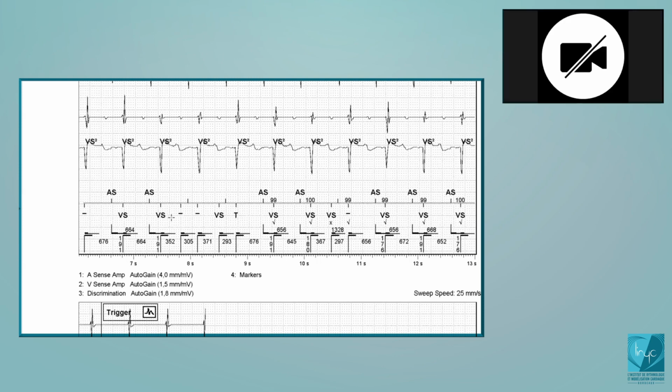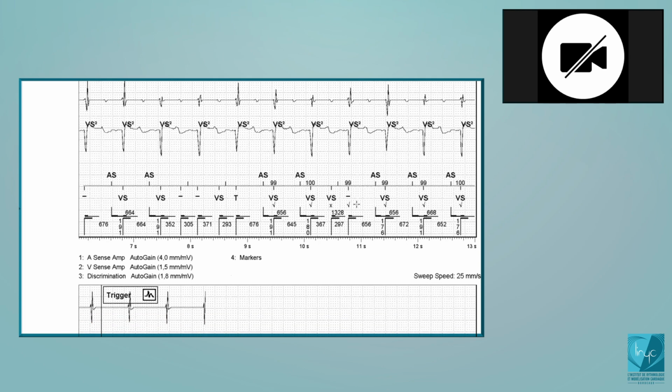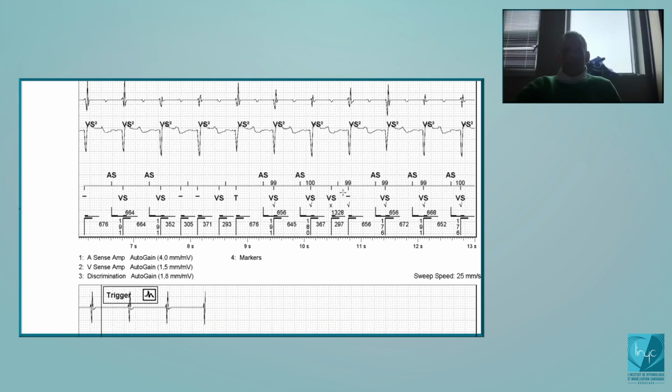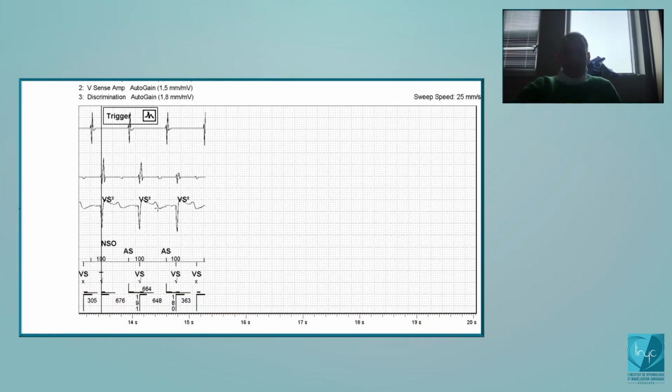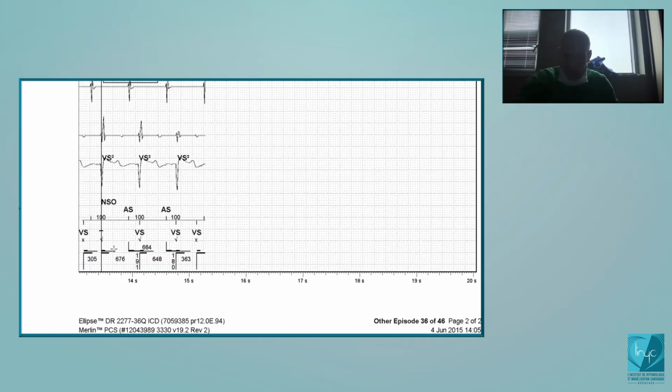You see, there is T-wave sensing, but without implementing the counter of VT or VF, because the T-wave sensing is quite infrequent, in fact. And here there is a diagnosis of non-sustained oversensing. So that's a specificity also, something very important to understand.